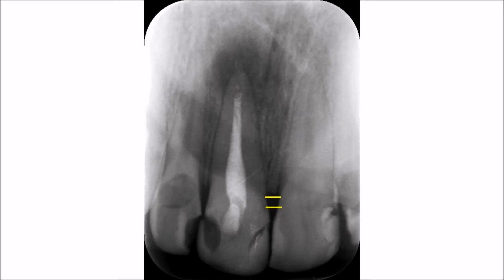As you can see in this radiograph, just like we did in the posterior teeth, we always do it in any area of the mouth, regardless of the position. First of all, we connect the two cemento-enamel junctions of two adjacent teeth, and then we draw a line that passes across the alveolar bone crest. In this case, the tip of the alveolar bone crest, because it is more of a knife edge. Now, those two lines normally in a normal periodontium should be parallel.